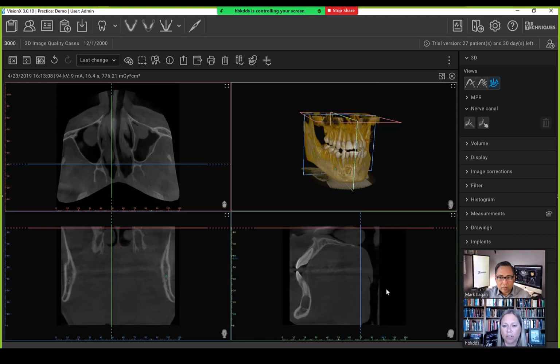And if you had the cervical spine, we would check that as well. So usually if you go right to the sagittal sections and you look right in the midline, if you have double cortical borders, then you know you'd have motion artifacts. Or if you see multiple streaks in your axial sections or your coronal sections, then we know we most likely have motion artifacts. And the sagittal typically confirms that. So this is a great scan. We don't have any motion.